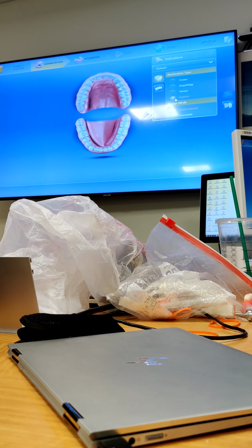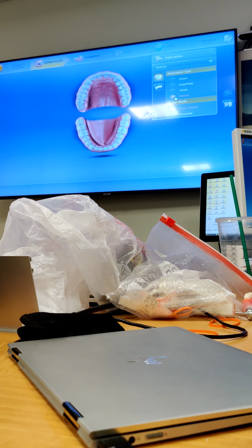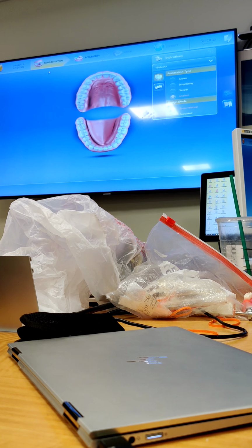Why are you doing it from Cerec Connect as opposed to one of the other sides, like the in-lab side, when you scan? Aren't there two different sides that you can scan on that machine? I'm learning too, because this is all not my job. I can scan it in chairside, but then I would do something chairside with it. Okay, gotcha. I could, but it'd be kind of roundabout. So all your implant stuff you do through Cerec Connect? Right. Well, to send it to Atlantis, or send it to Azento, or send it to Simplant, I do it through Cerec Connect.